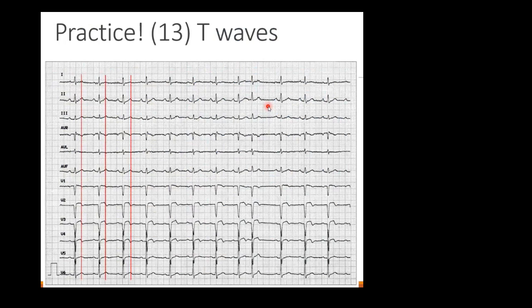Okay, so now when you're doing the T waves from all of this, you can sort of see here that generally maybe the T wave is positive. Here, it is pretty obvious that it is positive. Here, sort of as well. Here, yeah, probably. But now it's looking a little bit weird here. That's because over here it's starting to look biphasic.